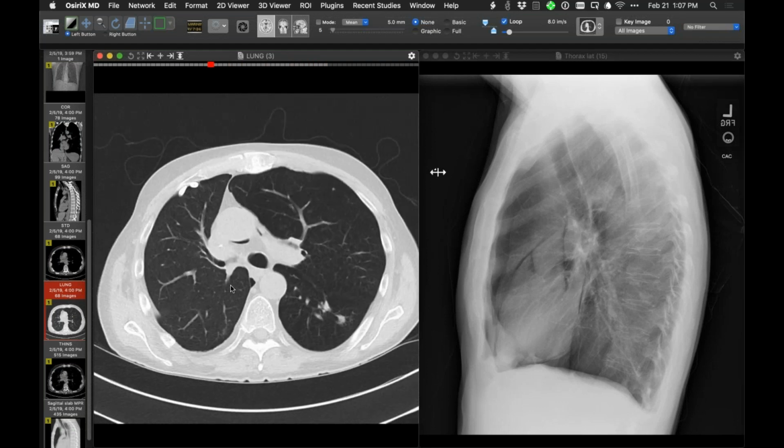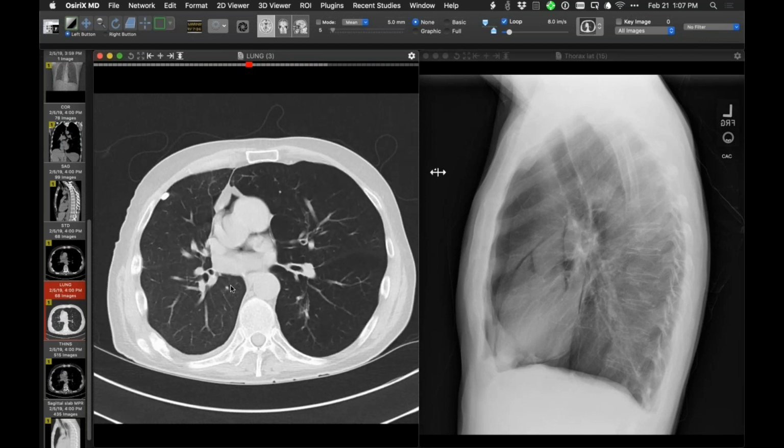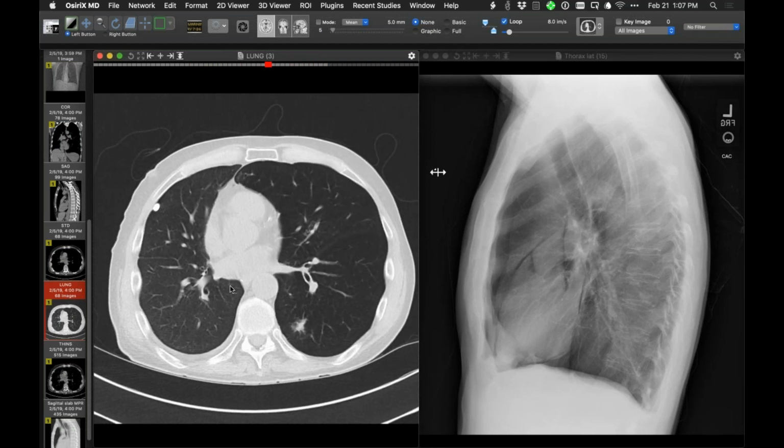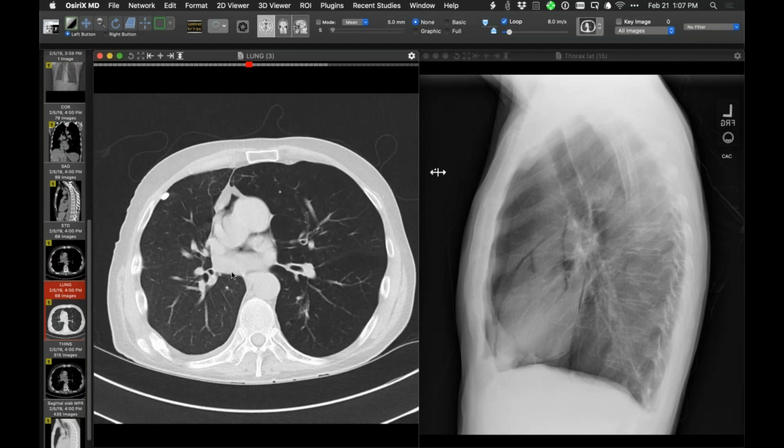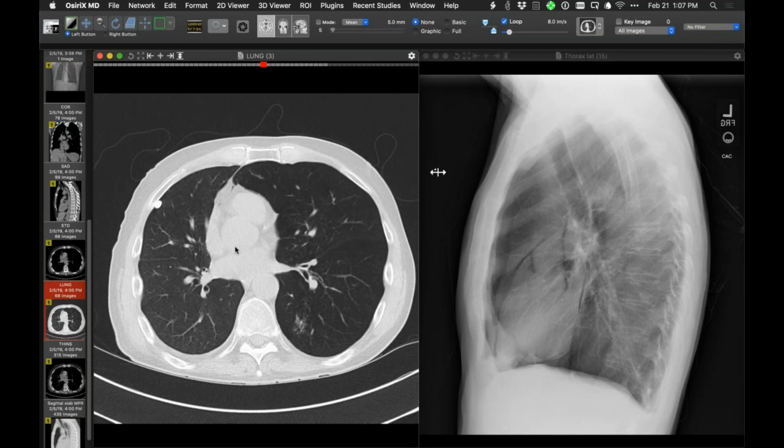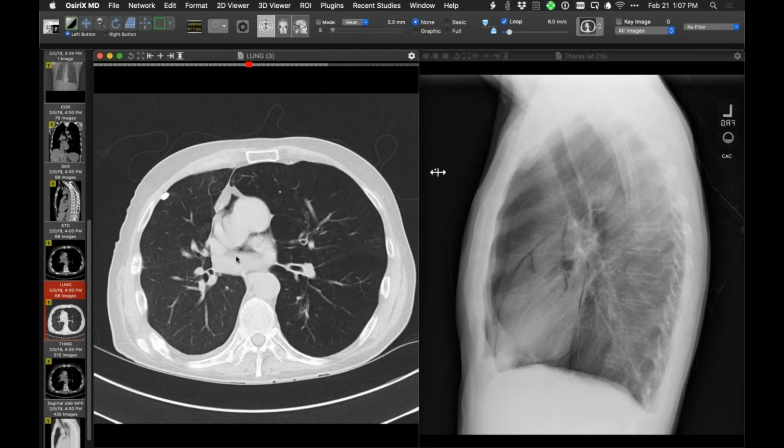Okay, so this could be if there's air about the aorta, but it's mostly in the recesses, as you indicate. Or maybe it's a bit of both. For example, it's a good thought. Let's have a look. Now, this is the next day.